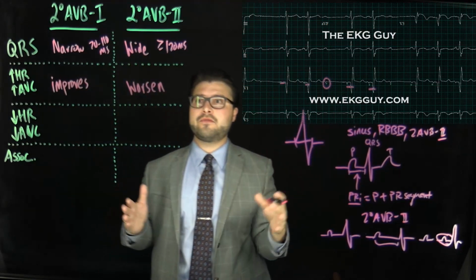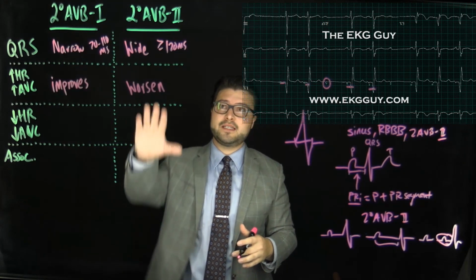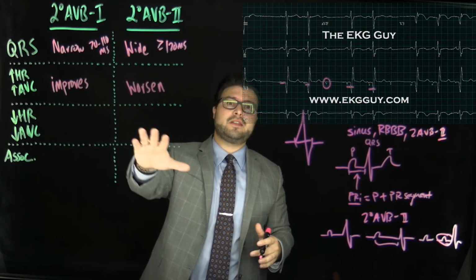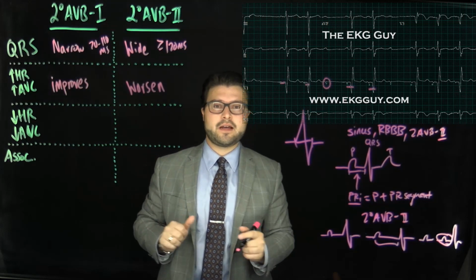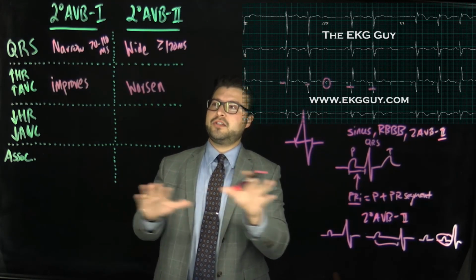Okay, and there's a lot of reasons behind this. It really depends on where that defect is taking place in each of them, and some are at different levels in the conduction system. We won't get into that all now. We go into that in the course, but that's essentially the reason why.